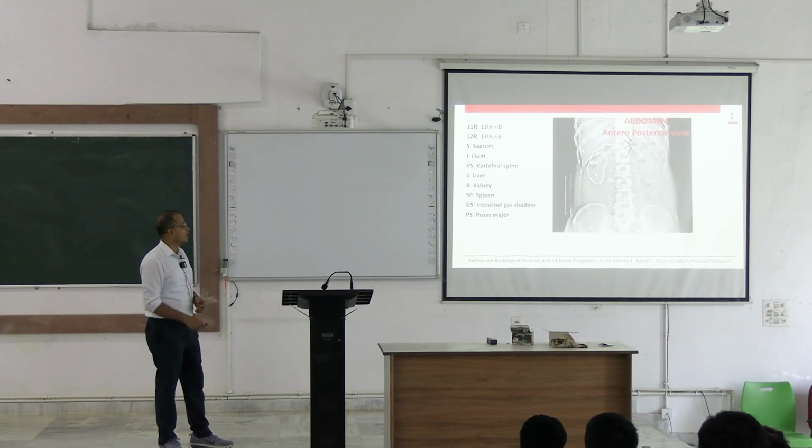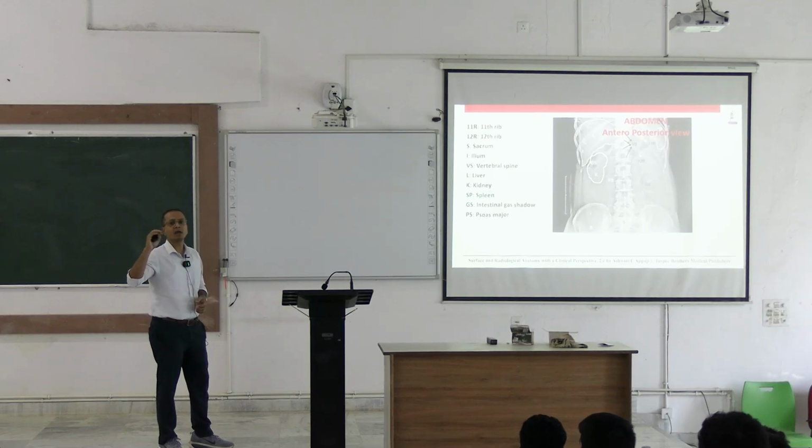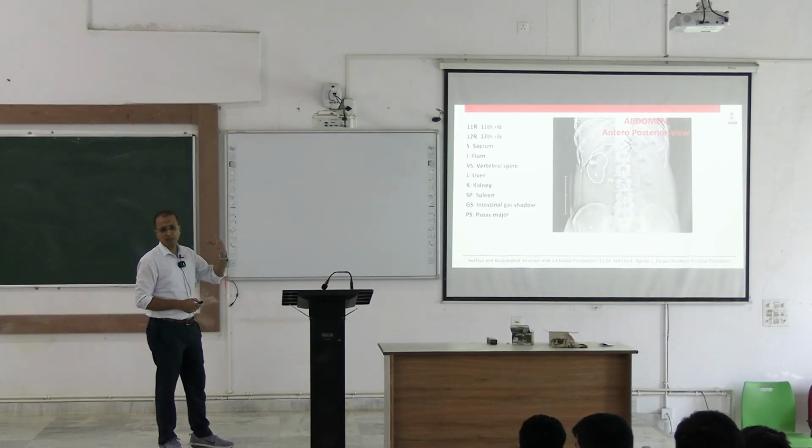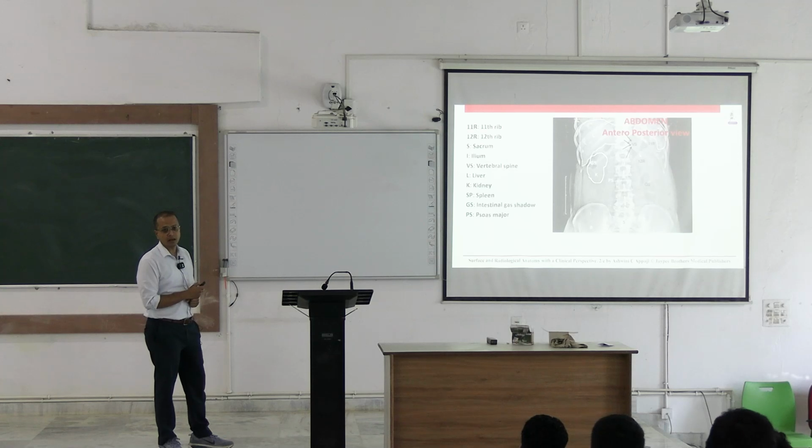Along with the soft tissue shadows, you see some areas which are blackened over here. This blackened area represents some kind of air entrapment, where air can be there in the abdomen, that you have to see. Like in this particular stomach, it may be the stomach fundus region. If you see this particular region having air shadows in the black like this, you may have the small intestine holding this air.